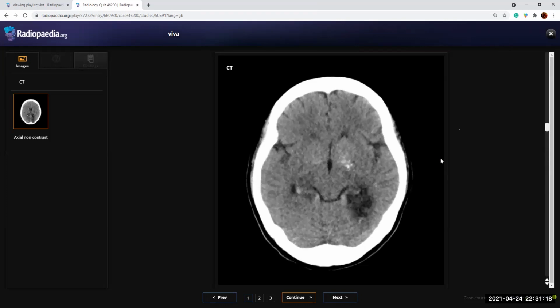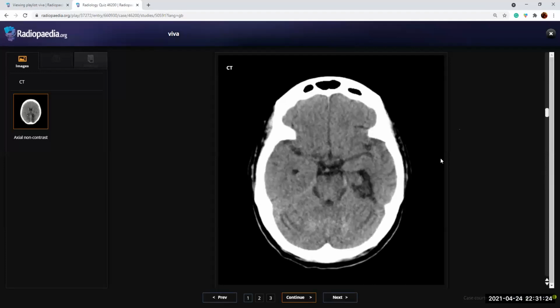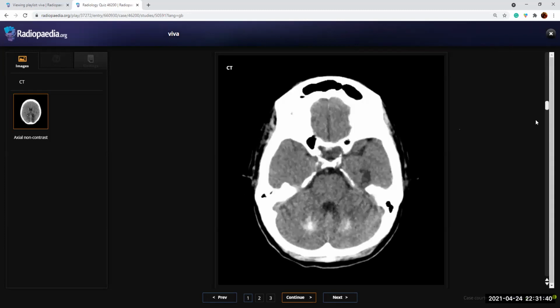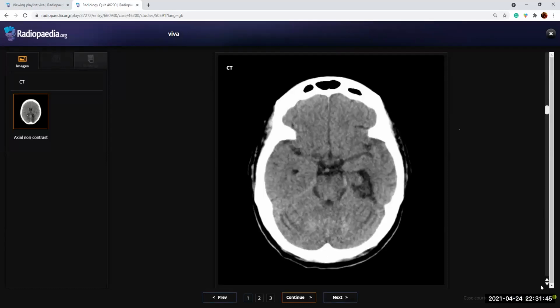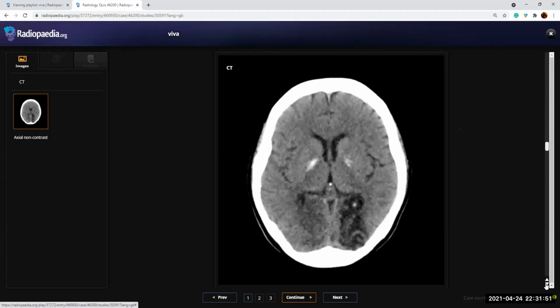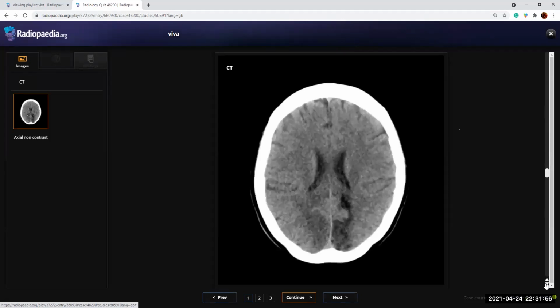There are also bilateral hyperdensities of the globus pallidus. Okay, this patient you described, but this patient had an acute presentation. So I'm trying to look for a possible mass effect or effacement of the cortical sulci.